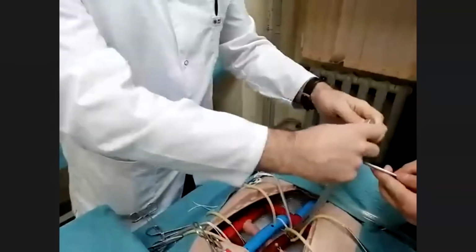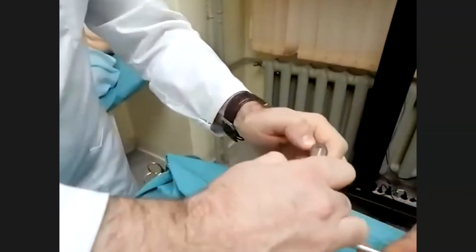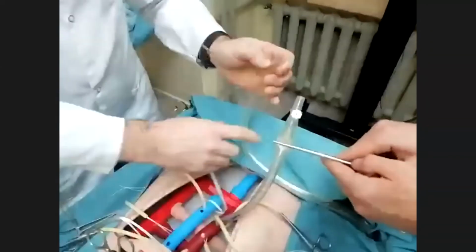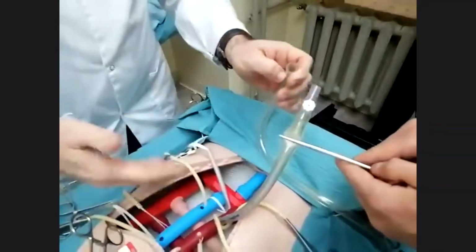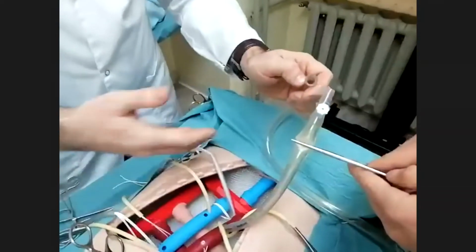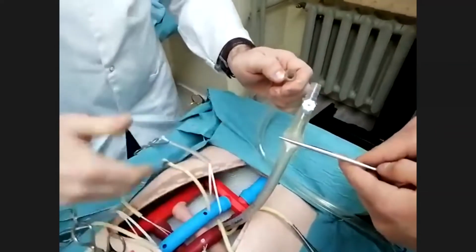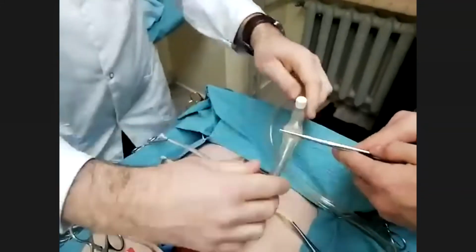This is a wet connection in real surgery, but this is a type of simulator without liquid, but we're able to make the circulation in this system also. Connecting.